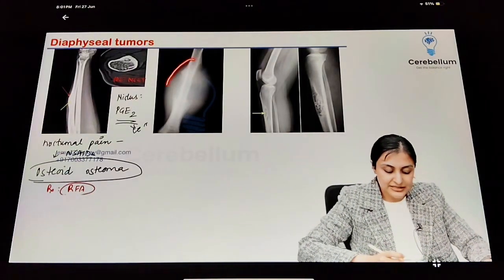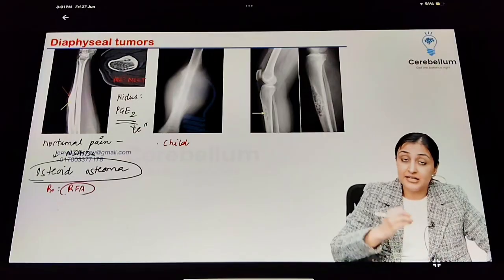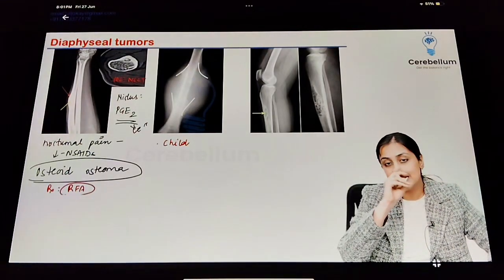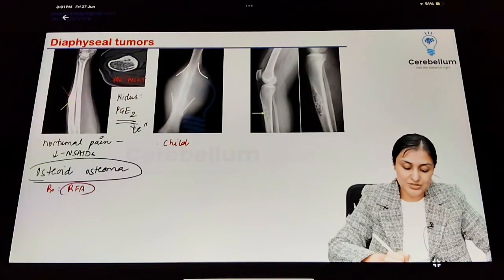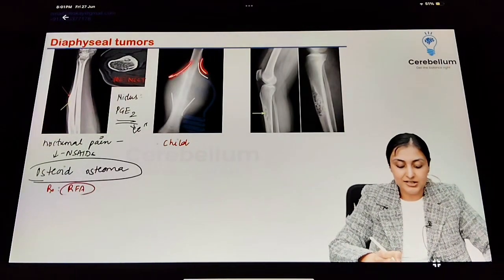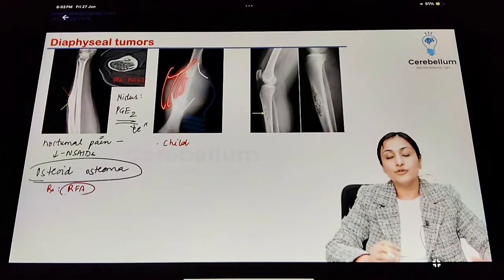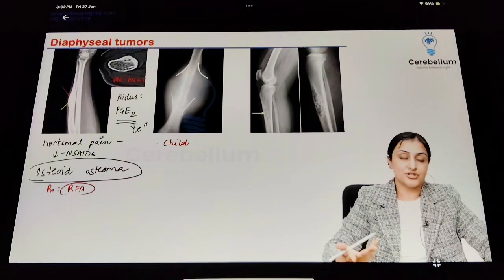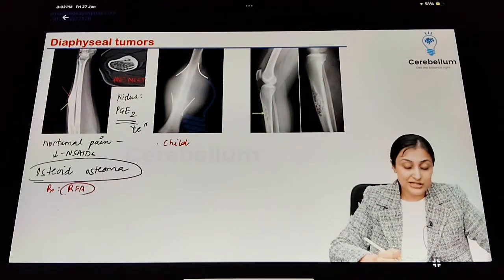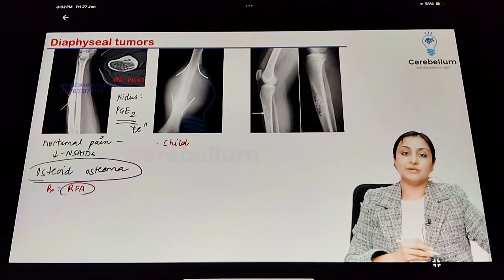Look at this diaphyseal lesion, huge mass. So they'll give you that there is a child here, a child in the first or second decade having a huge mass. You can also see that the periosteum is interrupted. Another misconception students have is that whenever you see onion peel, only then will it be Ewing sarcoma. When you see such a triangle, it is osteosarcoma. Not really. Codman's triangle, onion peel, all of these just represent aggressive tumors. They are periosteal reactions representing aggressive growth. So it's not necessary that every time you see the onion peel, every time Codman triangle, it is osteosarcoma. No, both of them just tell me it's a malignant lesion.